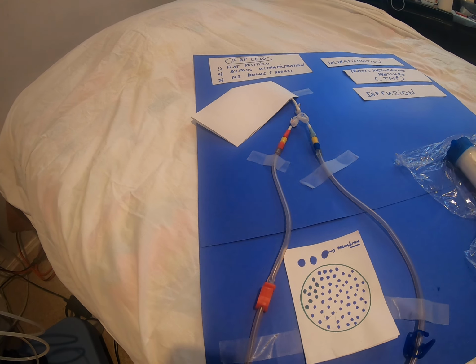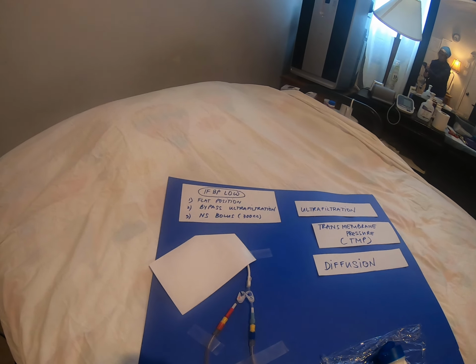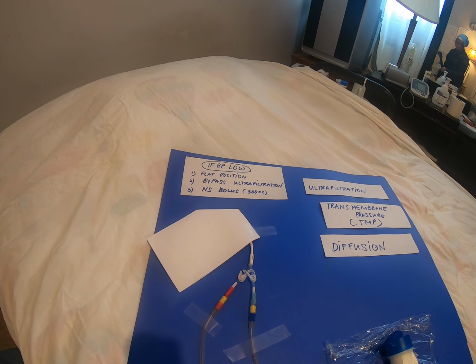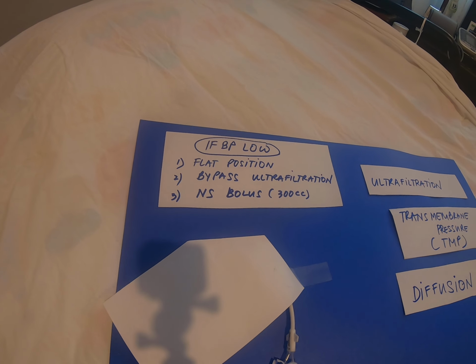Well, what if the patient seems like he might not be capable in spite of our boluses? Then you have to make that decision. In this case, because we had already put back all the blood to the patient, and we were able to give the bolus of 300 cc of normal saline, and we still feel that the patient might not be okay to carry on with the dialysis, then you have to end your dialysis, flush your tubings and everything, and call 911. That's the best thing to do.